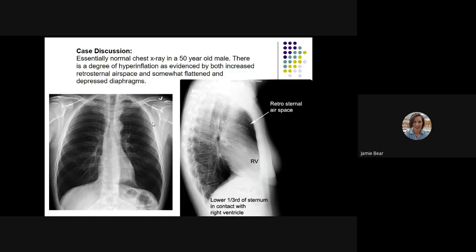Pneumonia, tuberculosis, lung cancer, cystic fibrosis? What do you think? It would be COPD. Good. I don't see pneumonia because I don't see anything that would be focal, and we'll get to that. But when we have air trapping, that indicates an obstructive lung disease. So COPD would be a good answer for this one.